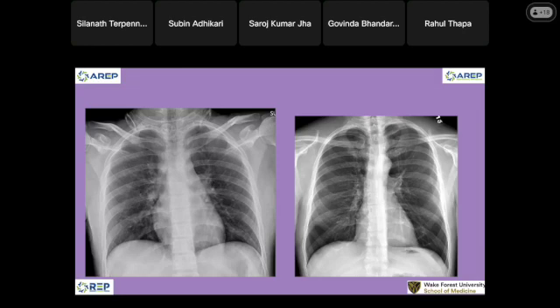So what do we see here? This structure is outside the aorta. Some of us say it's a stomach, or the esophagus. Yes, the heart looks big or not? The patient has a hernia, so it's not the esophagus. This one is a big sliding hernia.